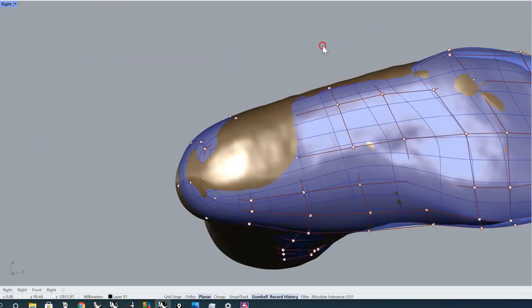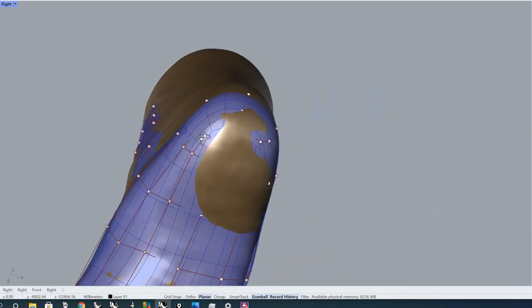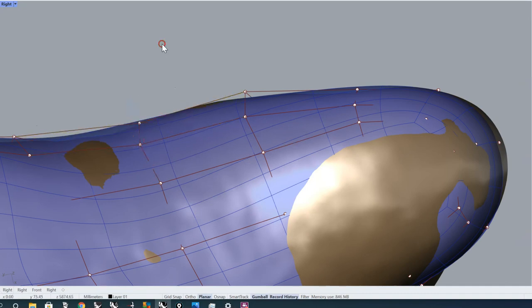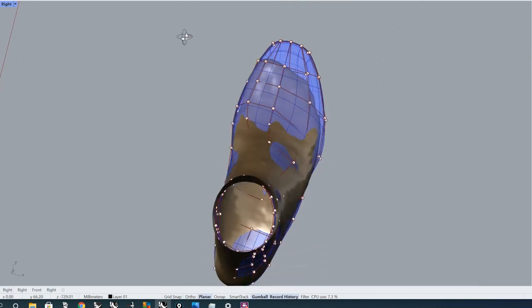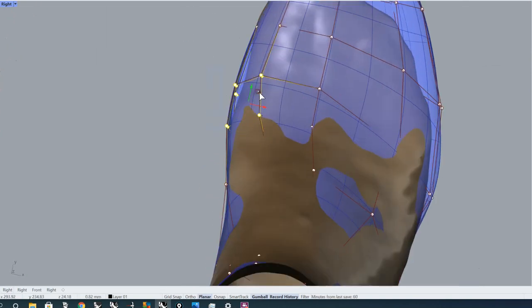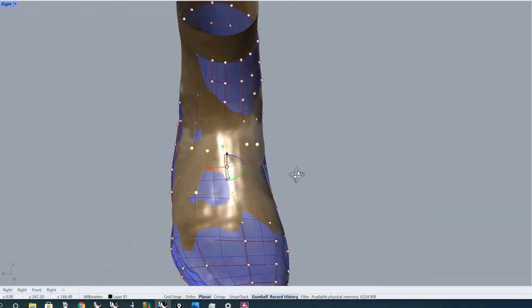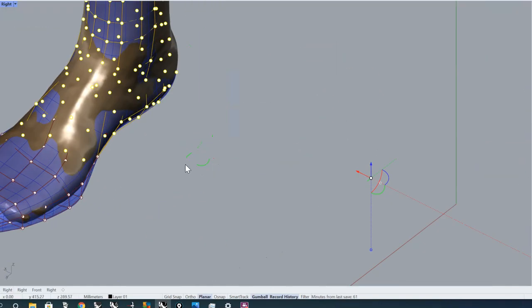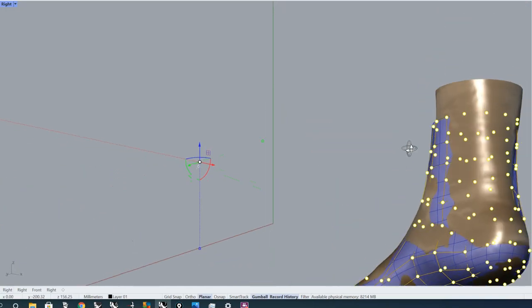And here's some. Okay. See, here's a lot of space. Okay. It's not perfect, but good enough at the moment. Maybe on this side I change it a bit. Okay.